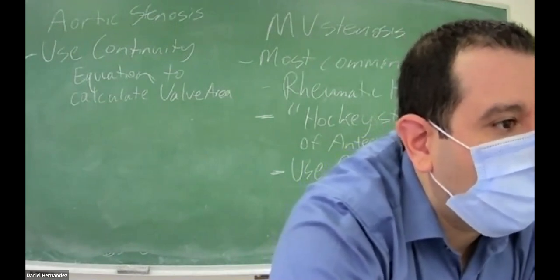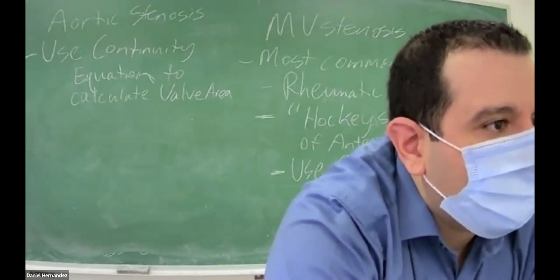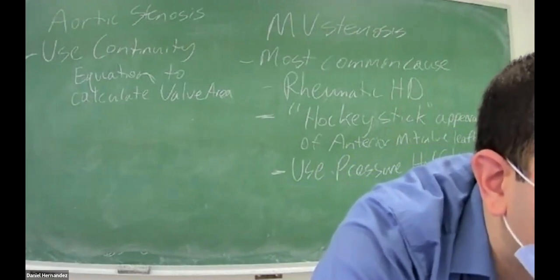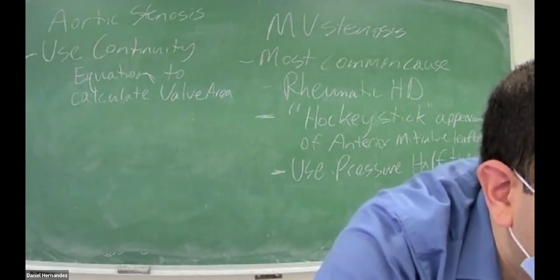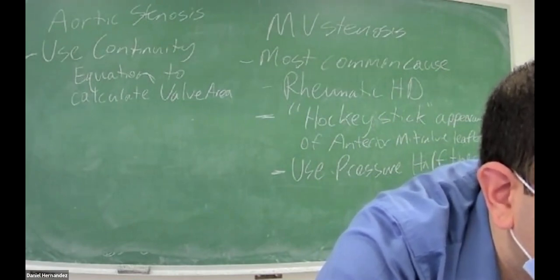Like dilated cardiomyopathy M mode findings: you can see the increased EPSS, the double diamond appearance, and the B notch, which is number 3.